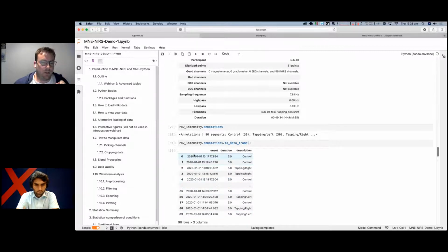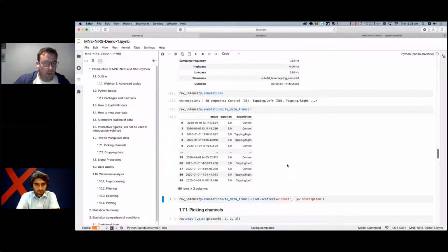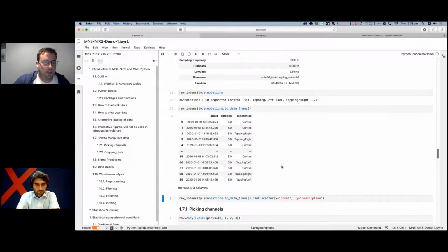One thing I forgot to mention for those who haven't used Python before is the first number is always 0. So if you look and say, oh, there's only 89 of these, Rob, but you said there was 90, it's because we're starting at 0. And there are also many ways to achieve the same outcome, like with all toolboxes.